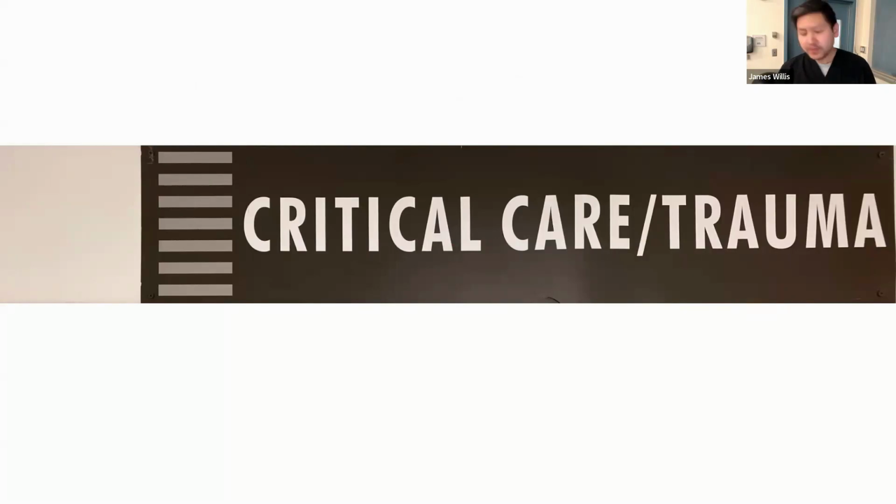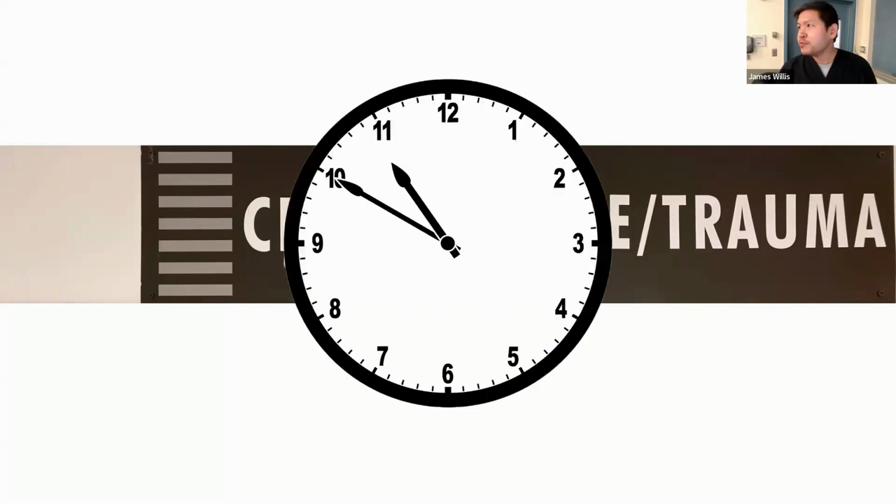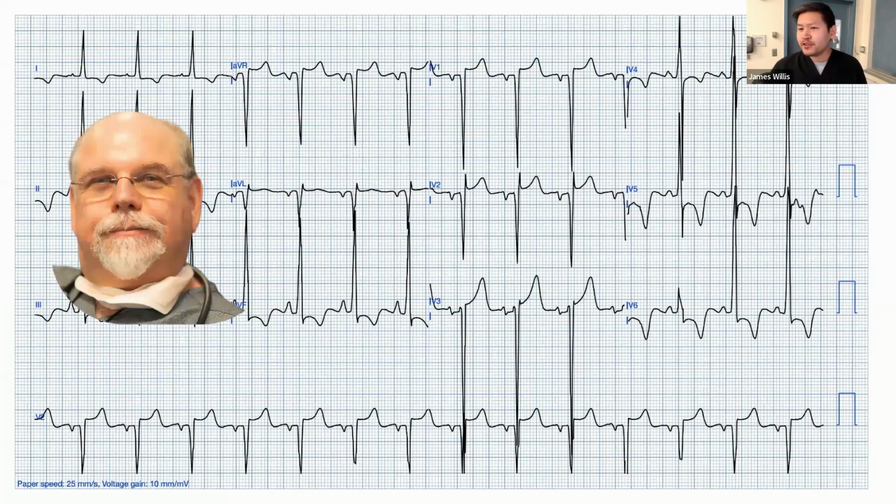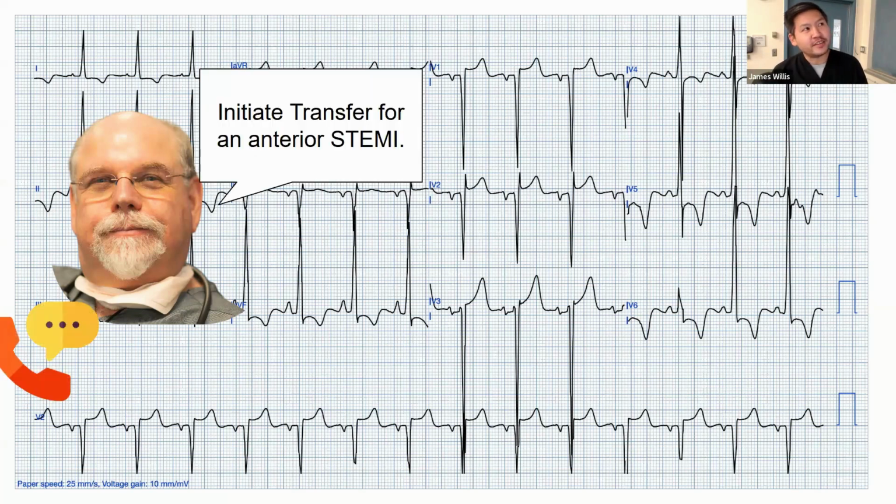It's CCT. It's 10:50, 10 minutes before shift change, and a patient rolls in with chest pain. You get this EKG, and you're with your seasoned attending. Seasoned attending looks at it, goes, initiate transfer for an anterior STEMI.